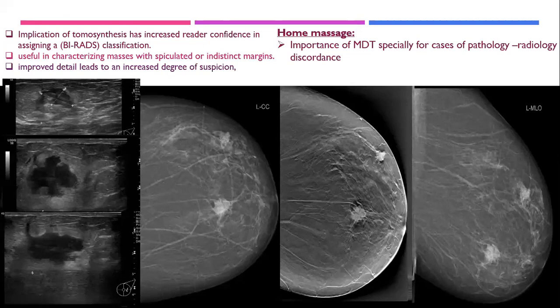The patient came later with progression of retained malignancy in her breast, and was then discussed in the MDT meeting and ended with total mastectomy.